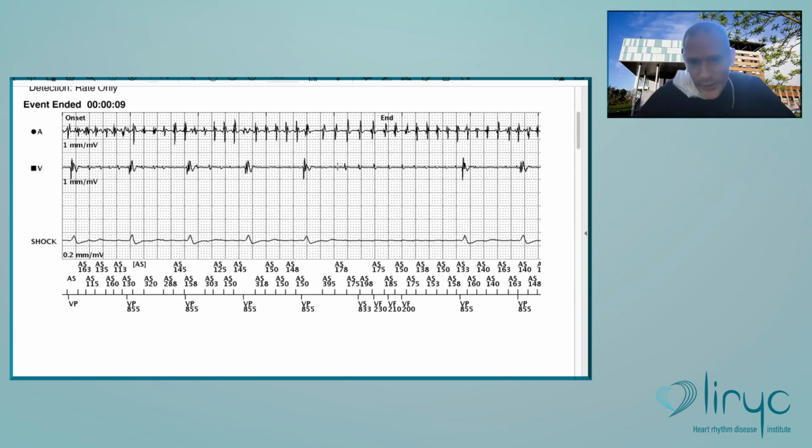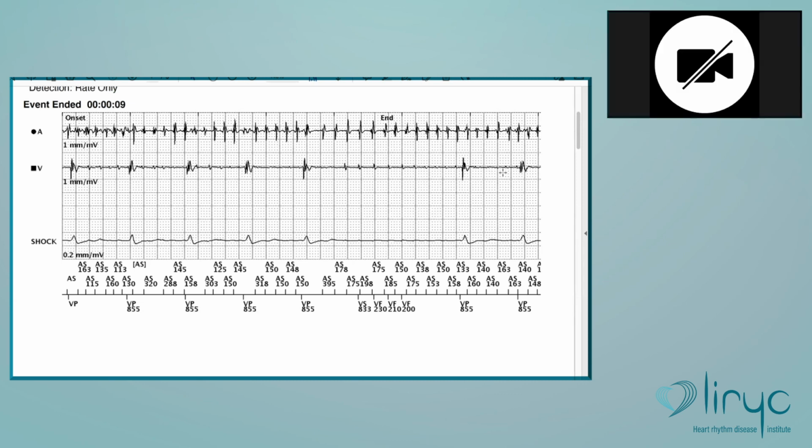It's not appropriate, but if you're completely dependent and there is oversensing, there is a risk of prolonged pause, no pacing, syncope, and then shock delivery. So the sequence of syncope before the shock means it's an appropriate therapy, but it's not true in this case.